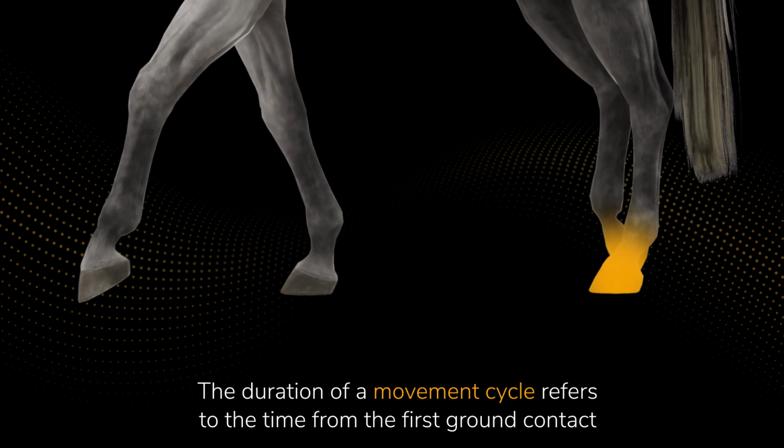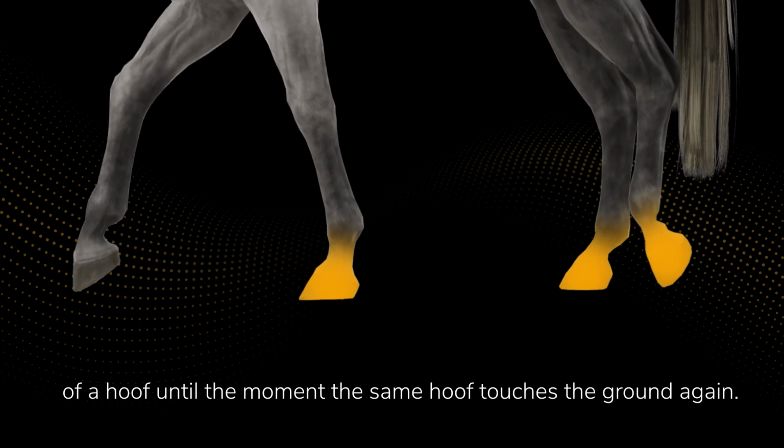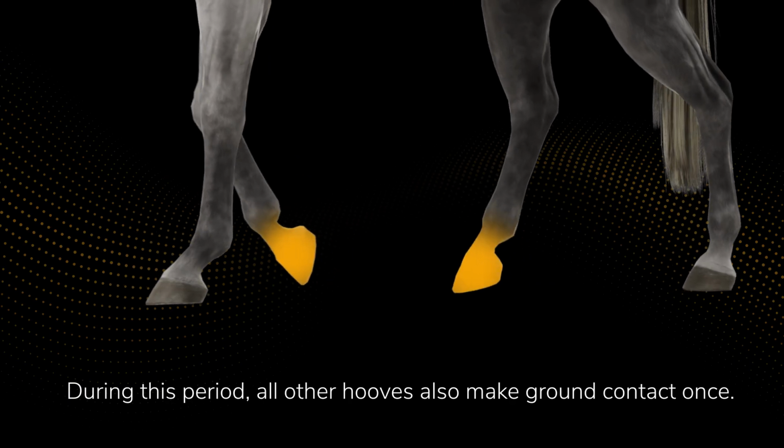The duration of a movement cycle refers to the time from the first ground contact of a hoof until the moment the same hoof touches the ground again. During this period, all other hooves also make ground contact once.